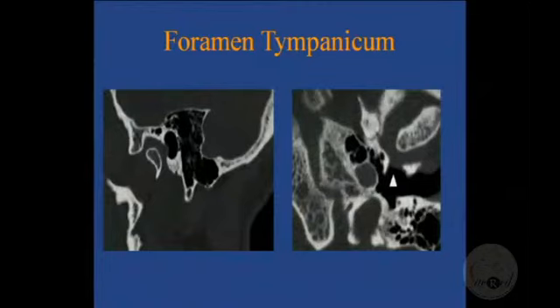But the significance of this one is these patients sometimes, if you notice here, this is the temporomandibular joint, and the synovium is here. Sometimes the synovium itself is the wall of that septum, and it can break, and the synovial fluid can leak into the external auditory canal, and present as clear fluid draining through the external auditory canal.